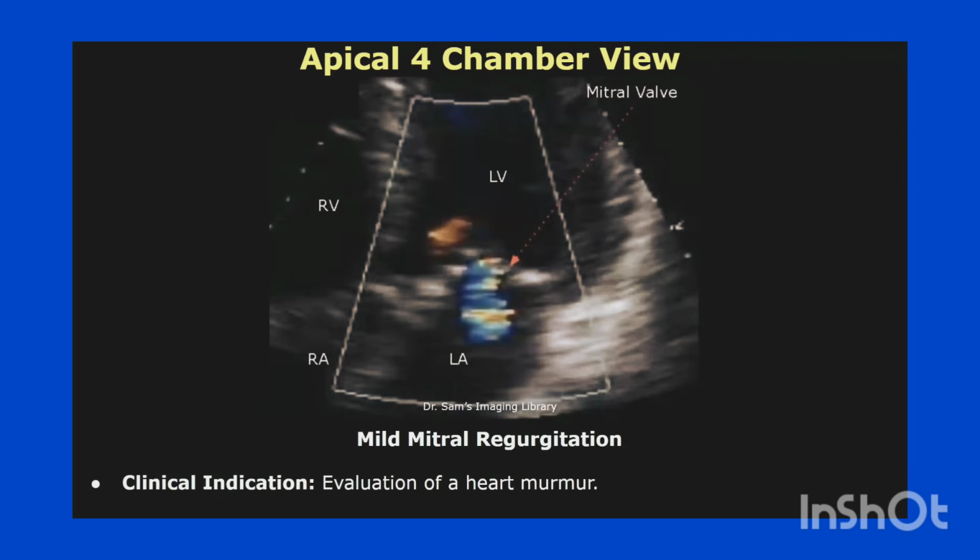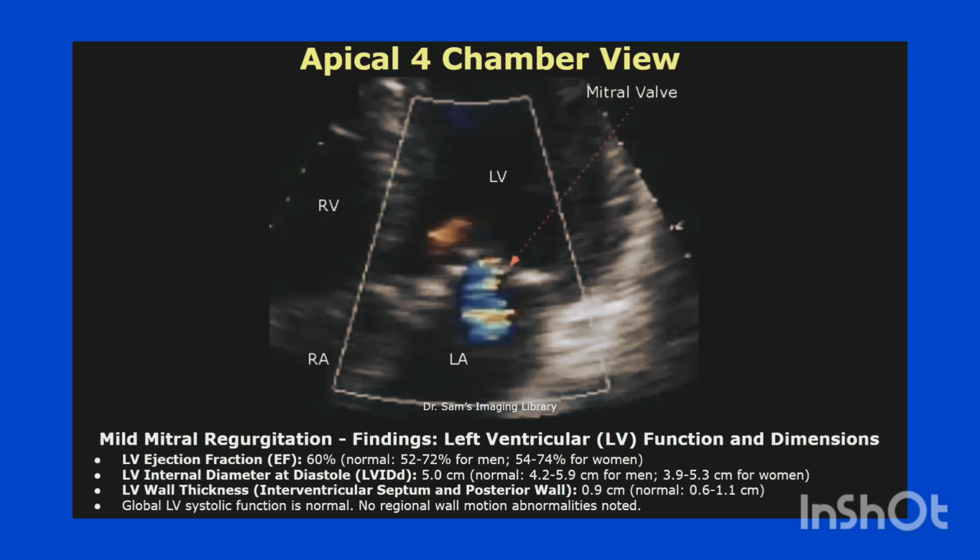This is a case of mild mitral regurgitation. The indication is evaluation of a heart murmur. The ejection fraction is 60%.